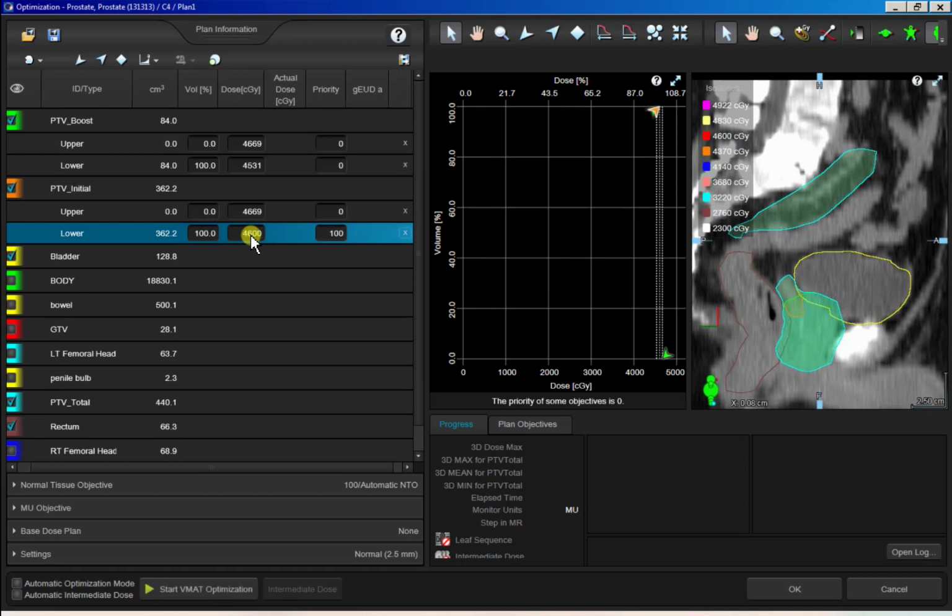I'm going to give you guys a pretty simple kind of formula and some simple rules to follow that you could use on almost all of your cases. Okay, and this is how I optimize my plans. Of course, there are some times we need to deviate a little bit or do some extra things and tricks, which we'll, of course, learn all about and go over as the semester progresses. But really, the bones of it, I'm going to show you right here.